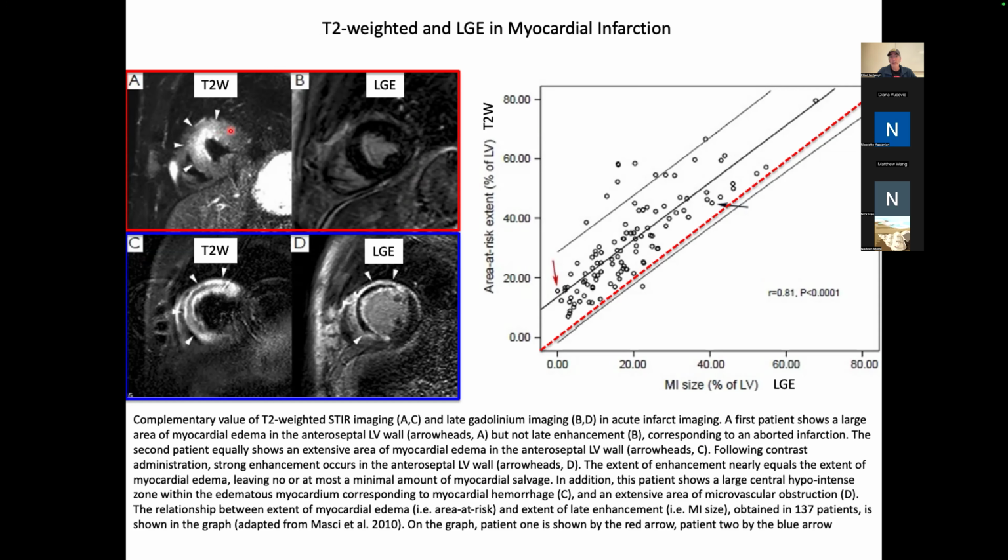And so we know, even though this image did not show any kind of abnormality, this patient has undergone a pretty significant challenge, in that there is a large chunk of myocardium that has extended T2.